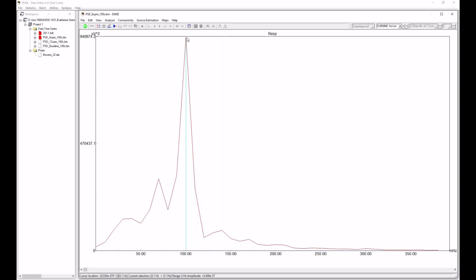Okay, so we definitely have a peak that dominates at 100 millihertz.